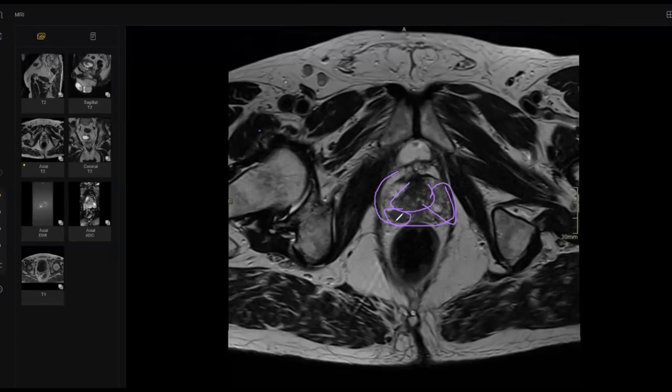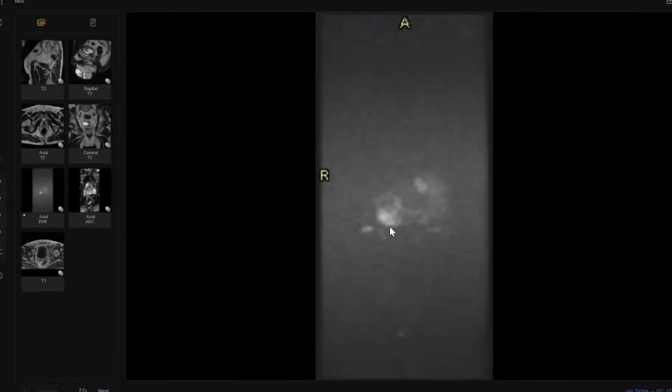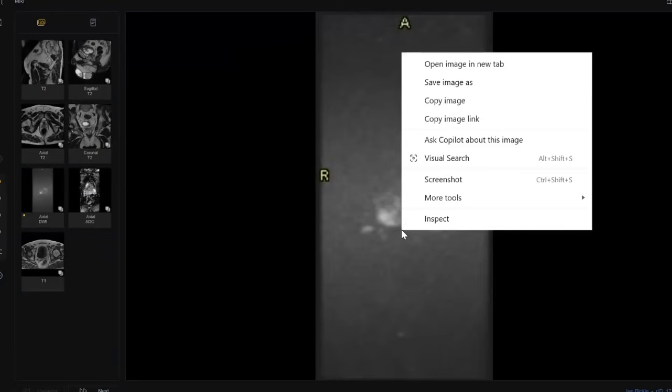And this is very important. When you see markedly dark T2, I'm talking as a general rule in the prostate, markedly well-defined and dark T2 is highly suggestive of malignancy. Markedly high diffusion, sorry, is highly suggestive of malignancy. This is very important. Why? Because there are many grades of PI-RADS for the prostate. It depends, especially to shift from 4 to 5, according to the size and whether it is markedly high diffusion or not.